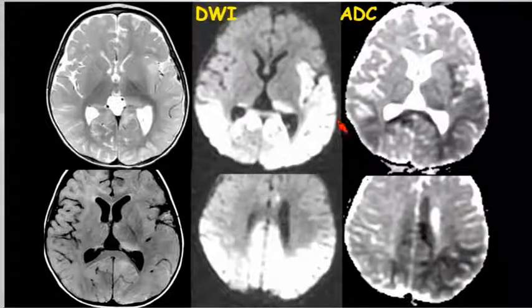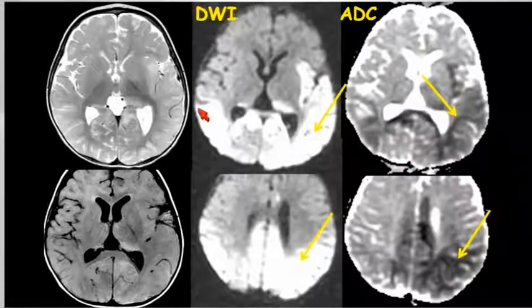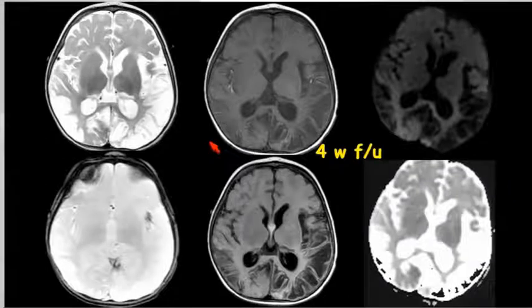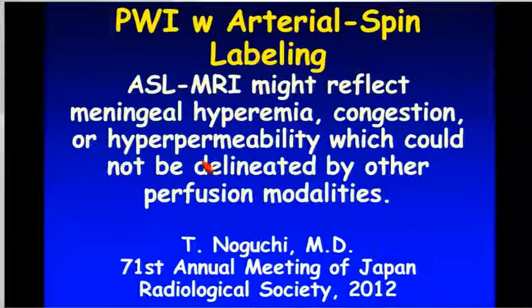You'll see this with things like neonatal herpes simplex infection, a different pattern than what you see in the adults, more regional areas. You also see this with things like listeria meningitis. And as we move forward in this unfortunate case, don't know the organism here, we develop a cystic encephalomalacia. And this happens, unfortunately, even sometimes with rapid treatment for these diseases.